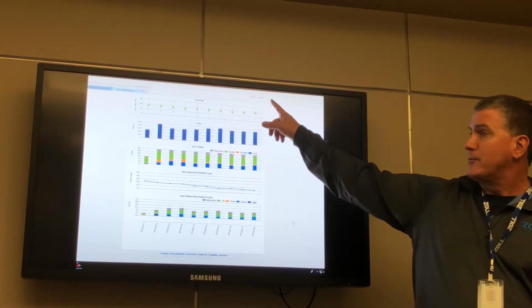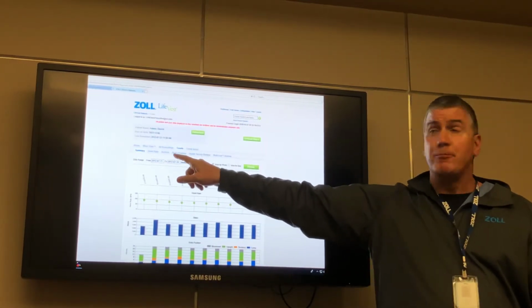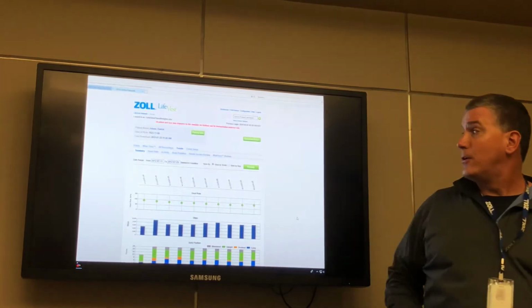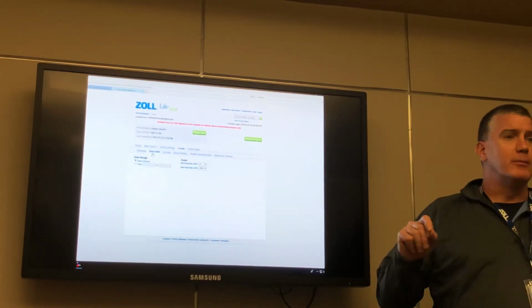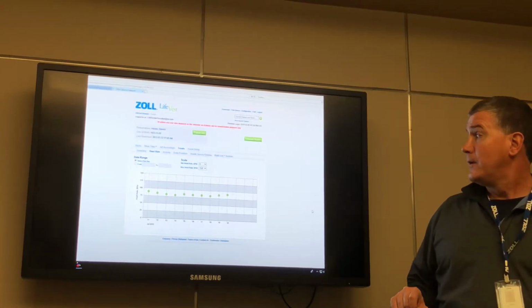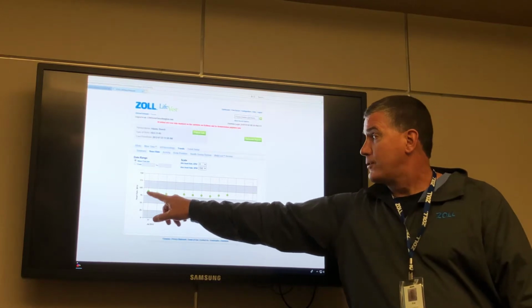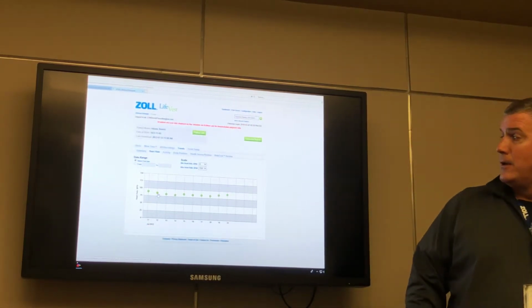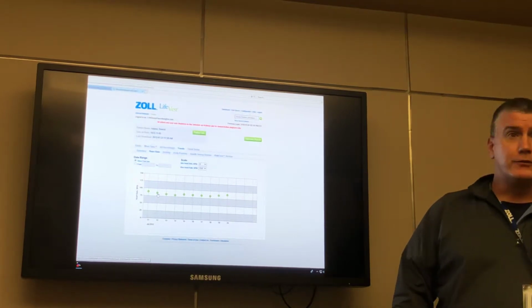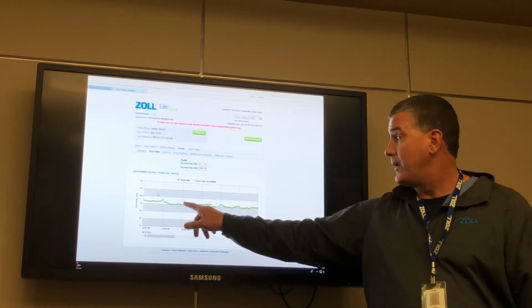Go back up, scroll back up. Thanks, Courtney. If you want to dig deeper, you can go to each tab. So go to the heart rate tab there. And this can tell you in 5-minute increments what's going on with their heart rate. All right. Click on, let's say, July 12th. You can scroll your cursor over that and you can see, so these are 5-minute increments here.